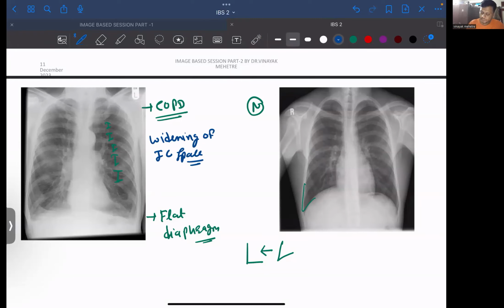You know? And take a look. In this X-ray the lungs look small. The whole rib cage looks small. But if you take a look at the COPD X-ray, it will look broader. It looks big, right? So there you will see a broad X-ray. This X-ray can come in the paper too, and this is the X-ray that you are going to see in your practical day-to-day life. Okay, everything is not just for the paper.